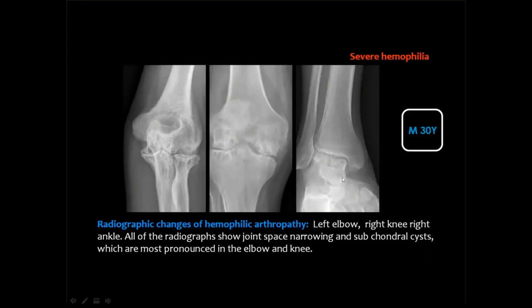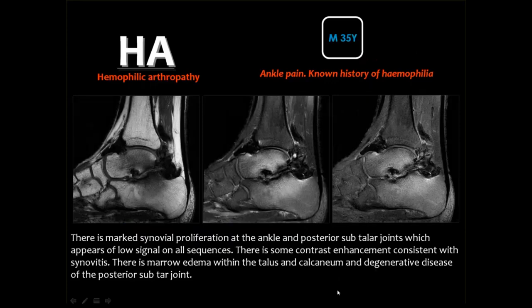And this patient also has the elbow and the ankle joint affected, but the ankle here is the last one to be affected. One of the characteristic findings is the talar slanting, or the medial sloping of the tibiotalar articular surface, which may be one of the diagnostic criteria.